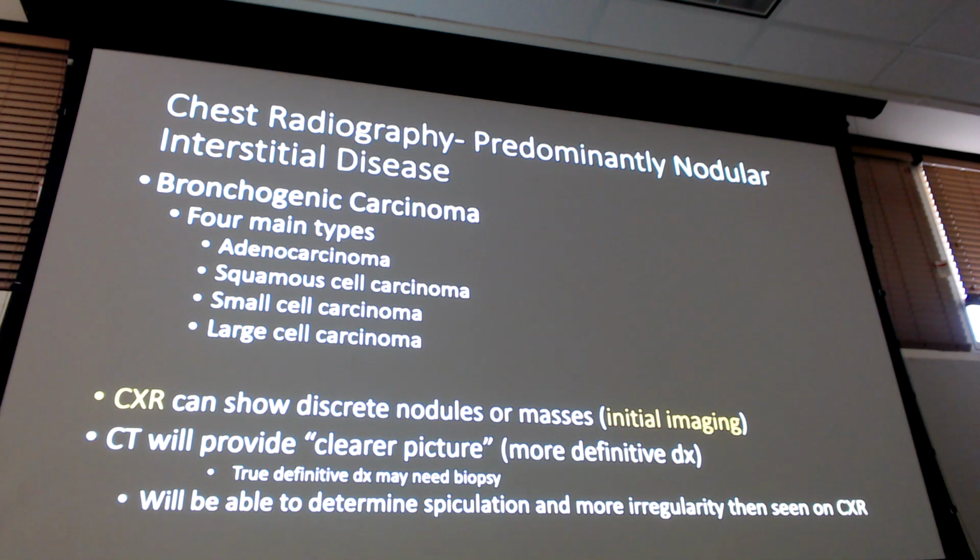Okay. The nice part about the CT is we talked about even with the breast masses, right? There are nice, well circumscribed ones and ones that are kind of spiculated and kind of fuzzy edges, which lead towards maybe, if there's such a thing, a good cancer or one benign tumor versus a malignant one. The CT can help define that a little bit more than the x-ray can, and that's kind of where that would come into play. But again, definitive diagnosis is going to be the biopsy for any of these potential metastases or carcinomas.